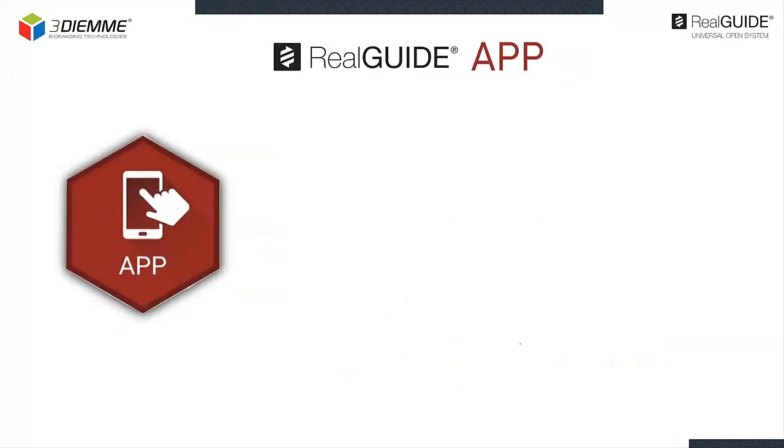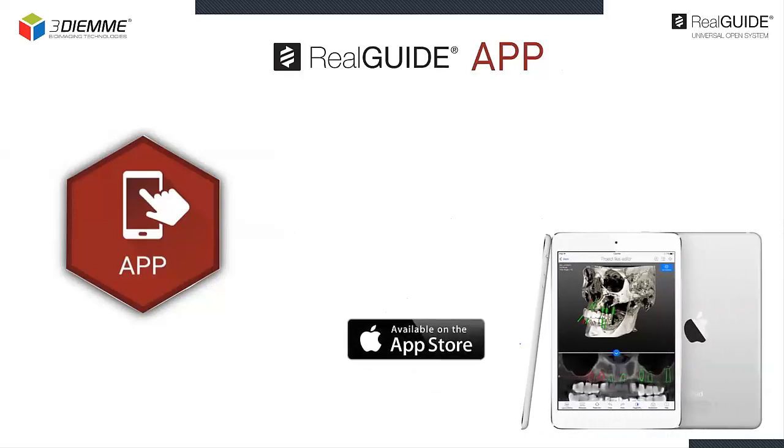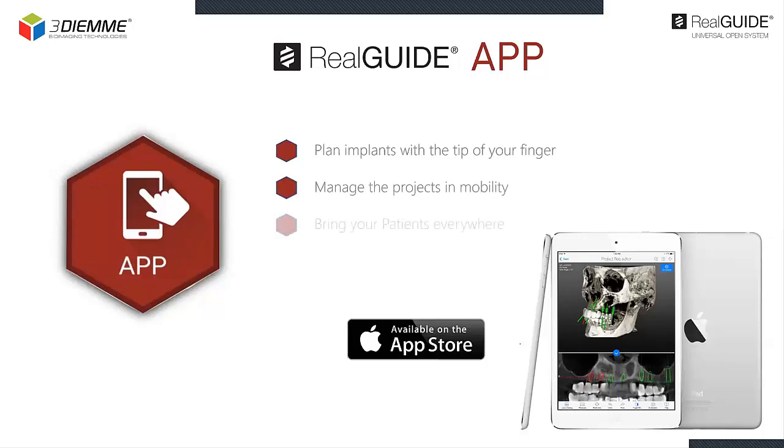As we have seen before, the Real Guide application is also available. You can find it on the App Store, and it allows you to plan and share your cases anywhere with your iOS devices. You can plan implants with the tip of your finger, manage the projects in mobility, bring your patient everywhere.